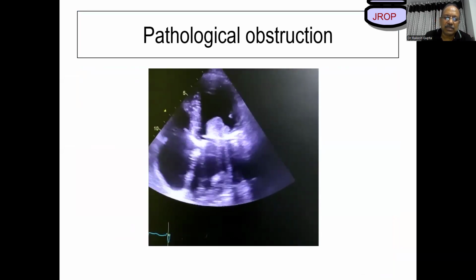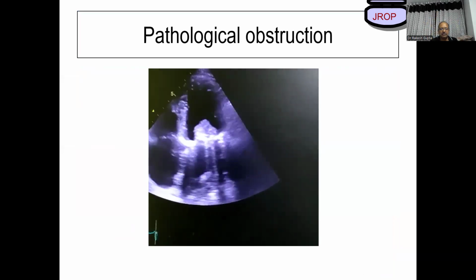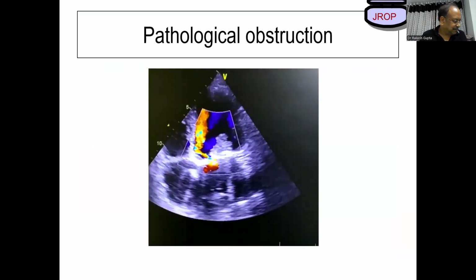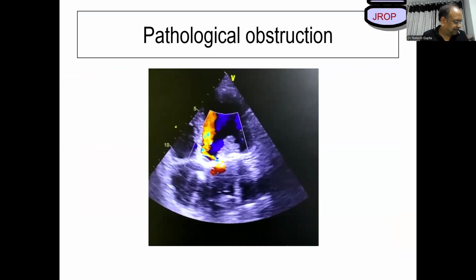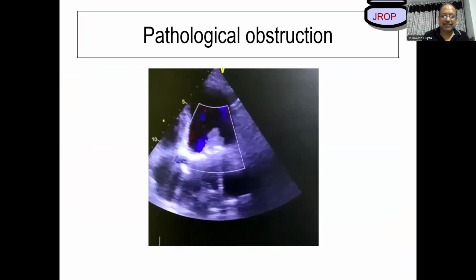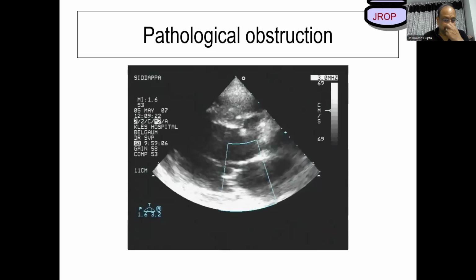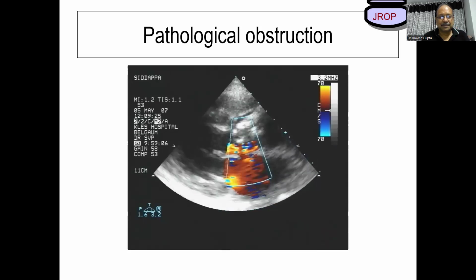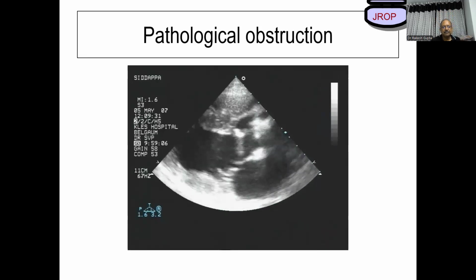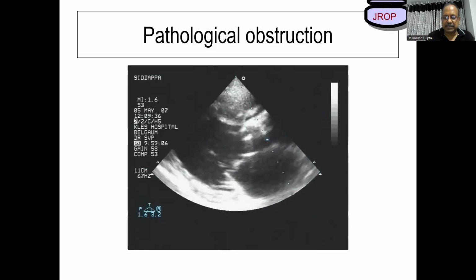Thrombus, pannus, or what? Anybody? Pannus. Below the wall. Another pannus.